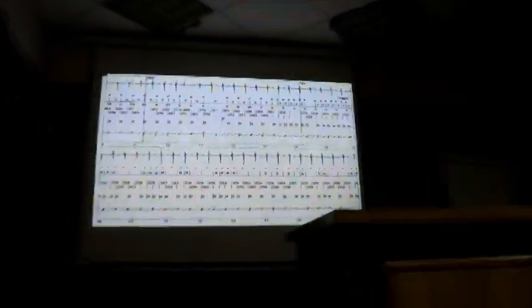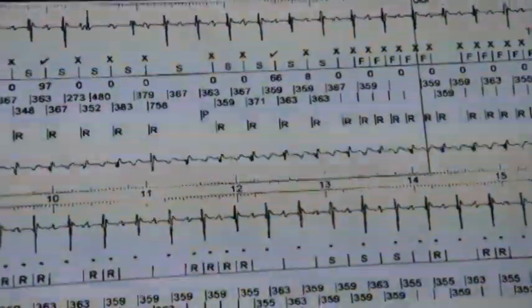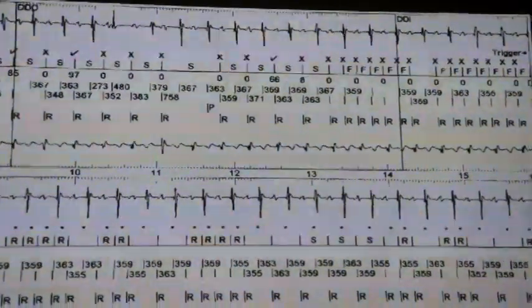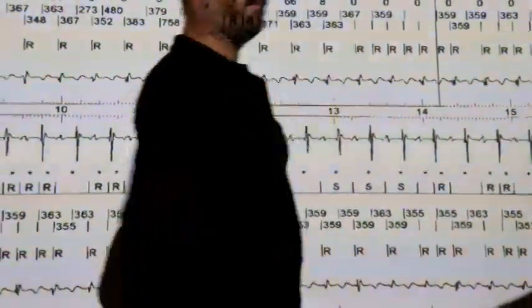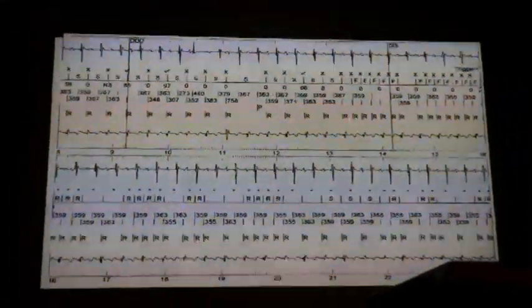Yeah, but see, this here to here, from the R wave to the T wave, is about 200, 220 milliseconds. He has a long one. You have to use the T wave. Yeah, programming like that. So we considered that, but look at these T waves.